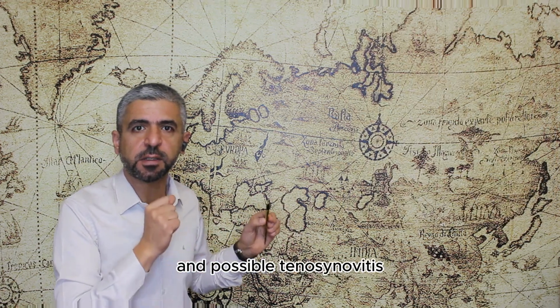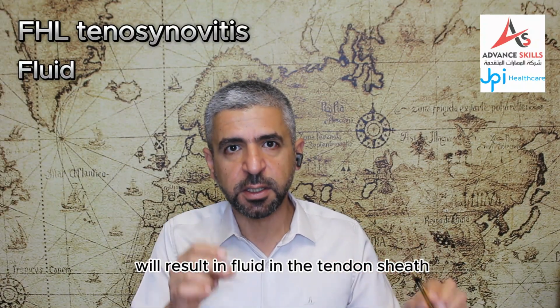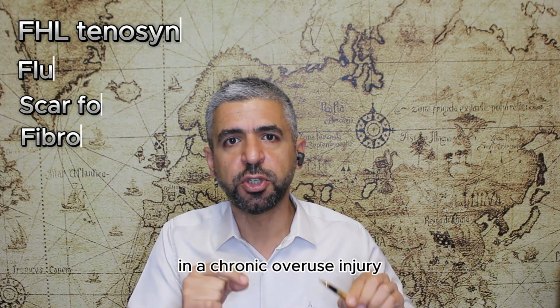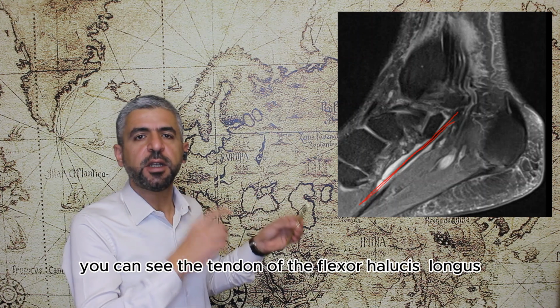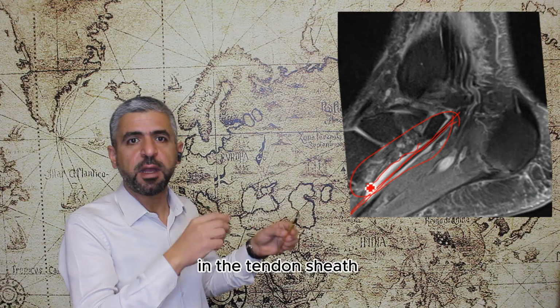Flexor hallucis longus tenosynovitis will result in fluid in the tendon sheath with scar formation and fibrosis in chronic overuse injury. Like we can see here in this T2 weighted fat saturated image, you can see the tendon of the flexor hallucis longus showing fluid accumulation surrounding the tendon in the tendon sheath.